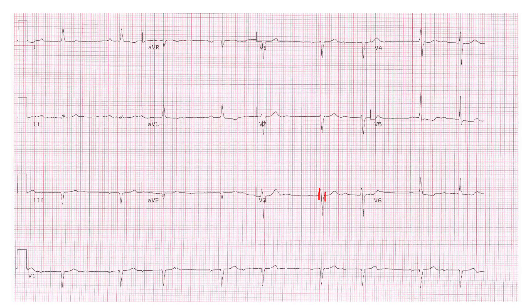Here is the end of the QRS complex. And it's right at about 120 milliseconds. So not really prolonged, still within the normal QRS interval. Okay, so I don't think I have a conduction delay, and I don't think I have a ventricular rhythm.